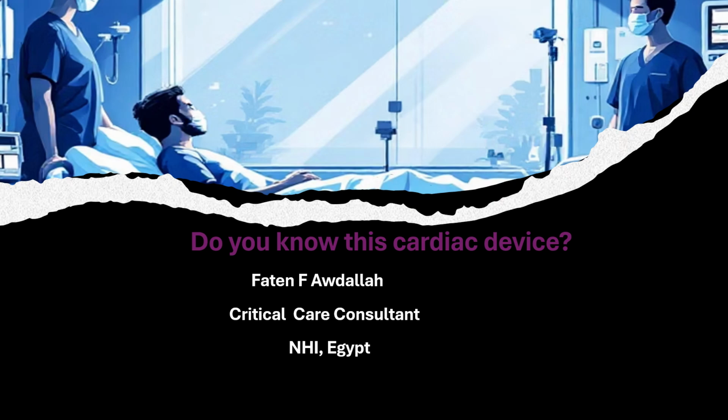Do you know this cardiac device? I received multiple questions regarding what's the difference between pacemaker, ICD, CRT in the X-ray when we use or choose any of them. So I tried to simplify it from an intensivist's perspective: how to use these devices, and how to differentiate them in the X-ray and ECG.